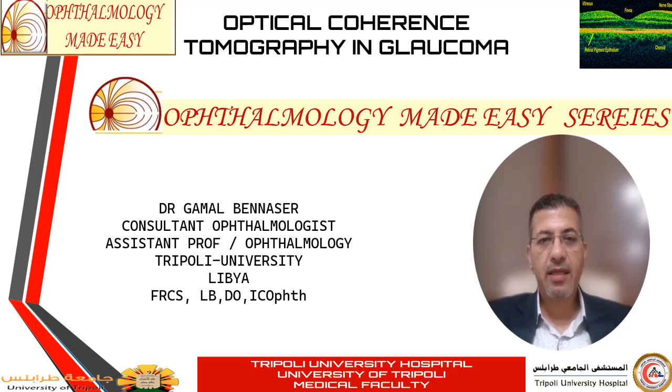This lecture is targeting all postgraduate students in the ophthalmology department, as well as all junior doctors who are practicing ophthalmology in different hospitals. In this lecture, we will simplify how we can read the OCT map.